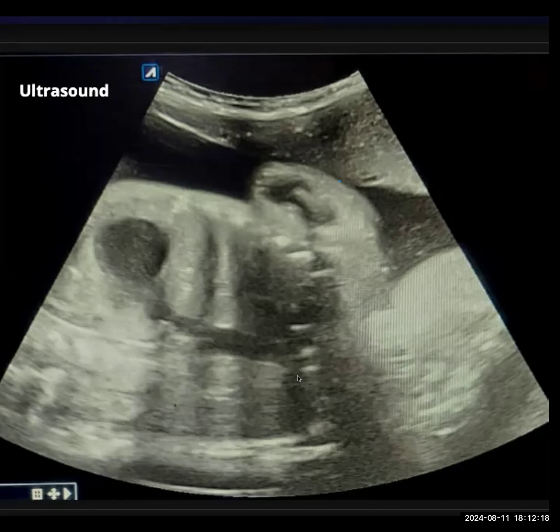I am not able to see the... What do you think this structure is? That looks like the aorta, or the major vessels. Can you trace that structure? Where does it end?